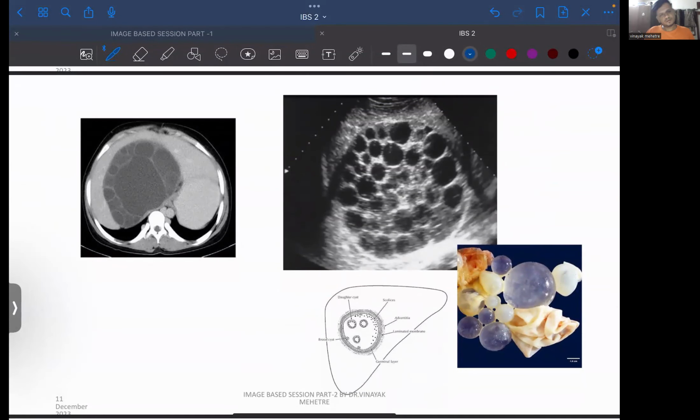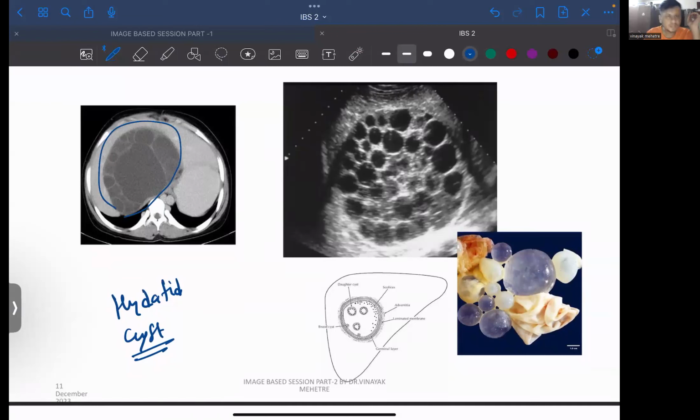सिंपल है ये वाला, ये तो बता दो. On CT scan, what you will see? Linings. Okay, there is an abscess with whitish lines. There is a kind of abscess with a whitish line in the middle. It is called hydatid cyst. Hydatid cyst of liver. Liver इस साइड में होता है, right? If we do ultrasound of that hydatid cyst, what we will see?